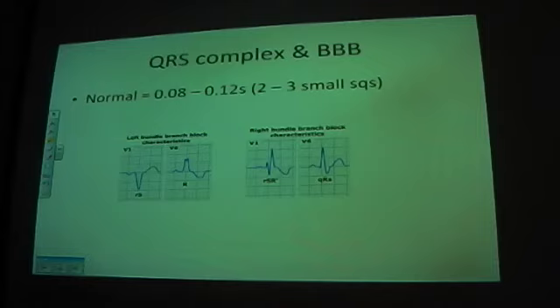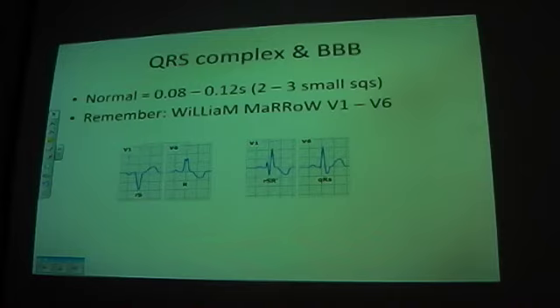Oh, and I thought I'd block them out. But you've got left bundle branch block on the left-hand side here, where it blocks out afterwards. Sorry about that.